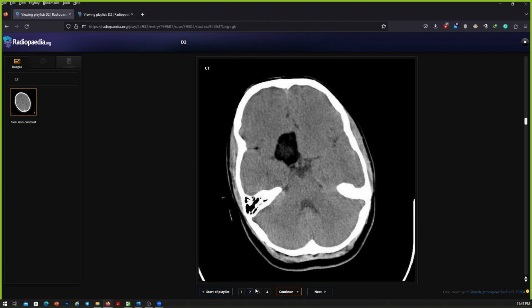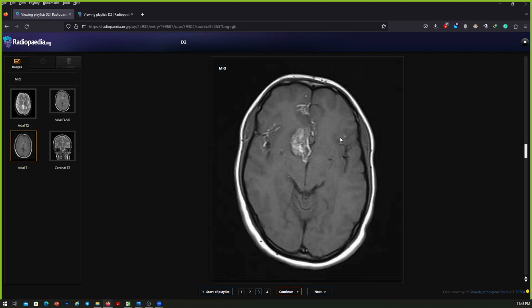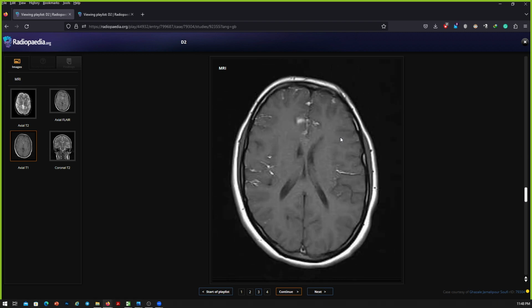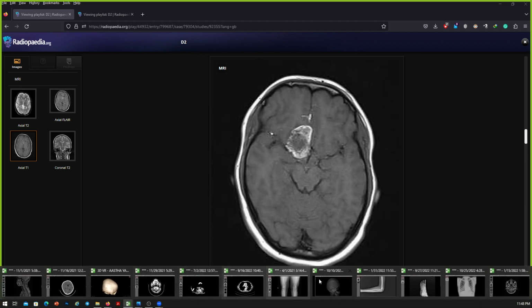Because what happens if you're not saying this, they'll go back to anatomy. They might start testing your anatomy. Then it's not good for you. So it's always better to be vague about it rather than to say that you don't know the location. I just showed the MRI, the T1 images, just to show it to the rest of the participants. So this was good. And let me see which the other cases was.